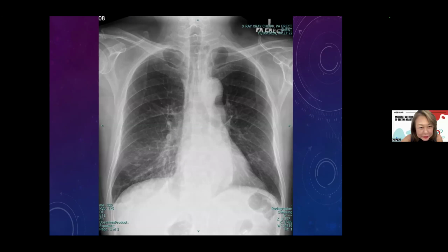This one? Let me think. I think you've shown this one before. No, this is another patient. Oh, this one, the left cardiac silhouette has no consolidation. No, this one nothing, but this one, yeah. I think I'll show this nodule only, actually. So don't forget to look for small nodules when you see an X-ray.